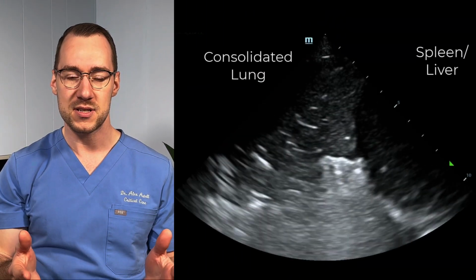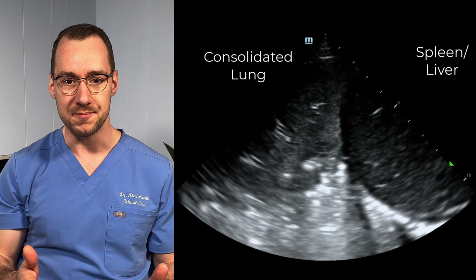Unlike with much of lung ultrasound where we aren't able to see the lung because of the presence of air, consolidations are areas where we are able to visualize the tissue because the lung is completely deaerated. Consolidations are also called hepatized lung, or originally a tissue-like sign, given that they have a very similar appearance to that of solid organs like the liver and spleen.